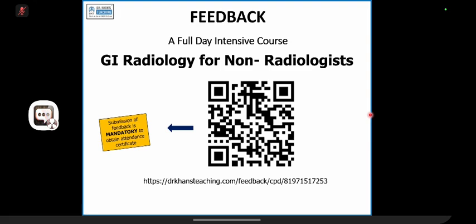When do they need the laptops for the workshop? So if anybody is interested to see cases workshop-wise during the session, in the next session I'll show you a few of them. So just open it now. The esophagus normal, and there is another one, I think a barium, and there is an esophagus T4 tumor. These are the ones which I will go through in the next session.